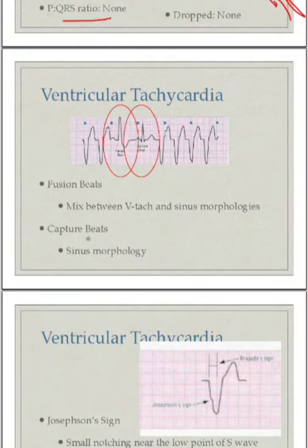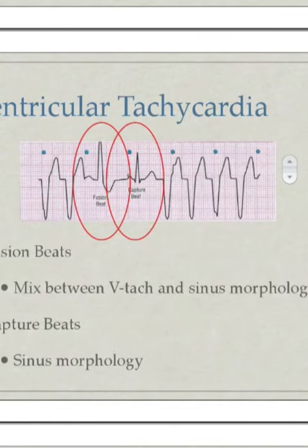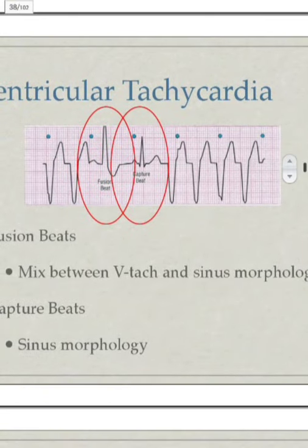Capture beat means that when finally there is a P wave and there is a QRS complex which follows, a T wave, that is a capture beat. Similarly, fusion beat is like, you know.